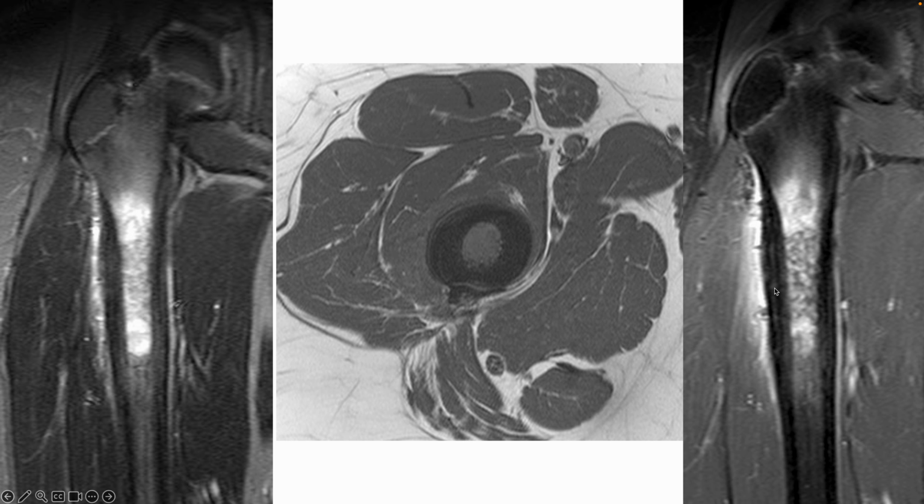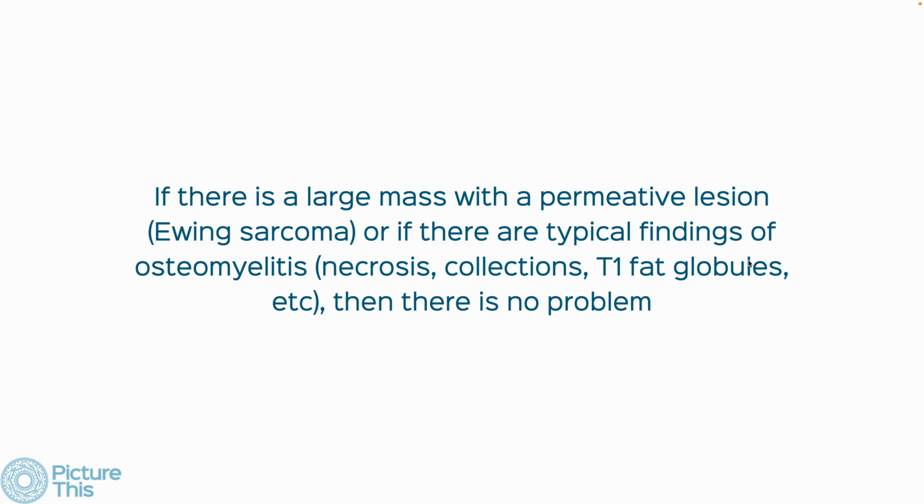And so when I biopsy the center here, and this is where you really don't know, is this osteomyelitis? Is this Ewing sarcoma? It turned out to be Ewing sarcoma. Now, there are times when the differentiation between the two is simple.